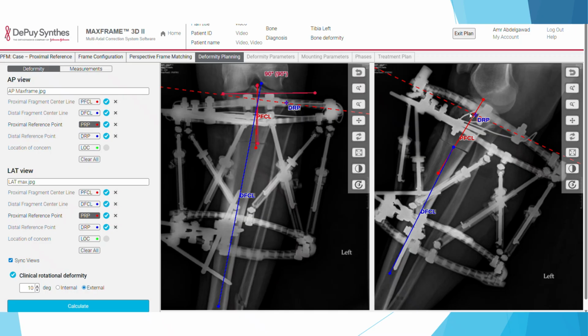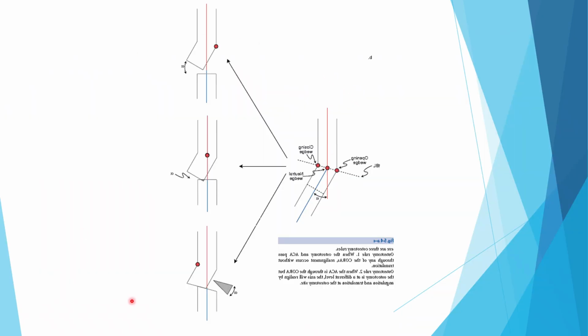And even if there's like 1 millimeter, you can always override it, as we're going to show it to you next. So you can see we did it here on this spot, and that will give you the best result, as I'm going to show you now. So let's go again to the diagram that we have been showing. And again, all this you can see in the deformity lecture and the principles of deformity assessment and how to do your osteotomies.